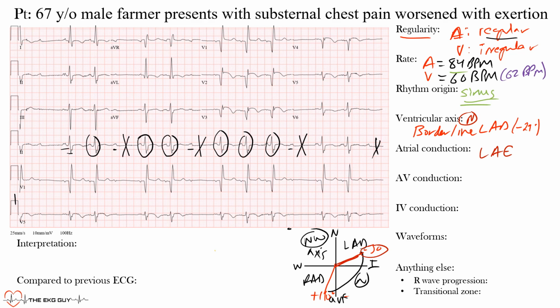All right, and what you have to notice here is the PR interval, which, if you look here, here's our QRS complex, the PR interval is from the beginning of our P wave to there, and it is actually constant when it's followed by a QRS complex, okay?